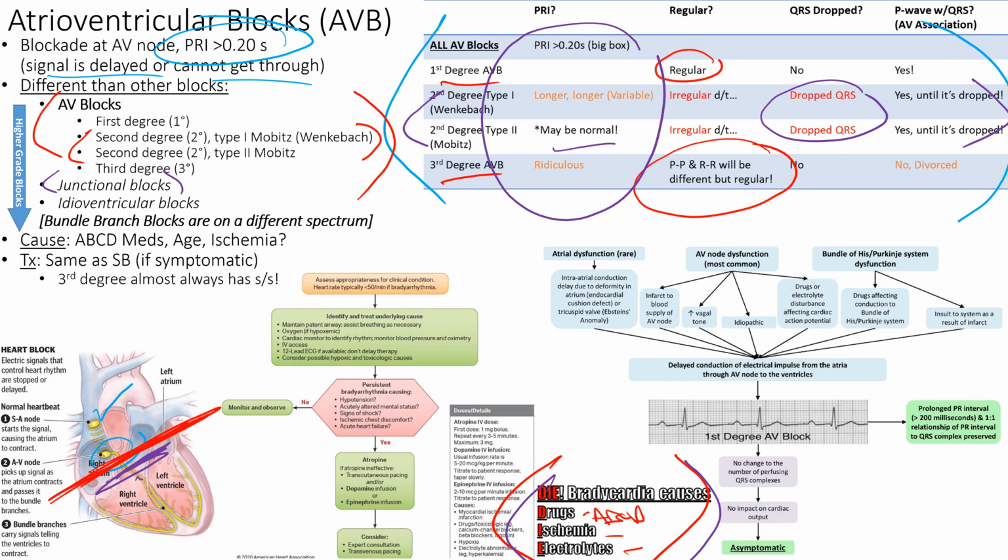I'm trying to figure a different color. There we go, idioventricular blocks, right? And that's where you're all the way down there in the His Purkinje system, and you're not involved in the AV node at all, right? The ventricles are the last effort to give you a heart rate and blood pressure. Okay, and we'll talk about junctional rhythms and idioventricular rhythms shortly.